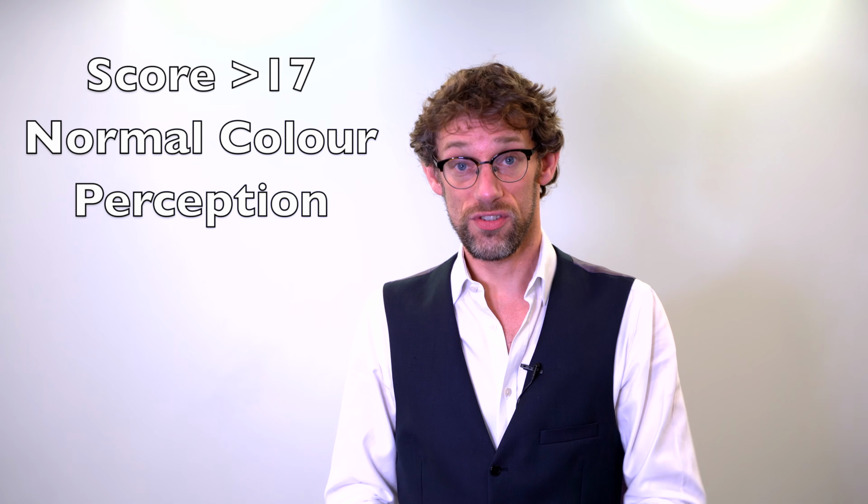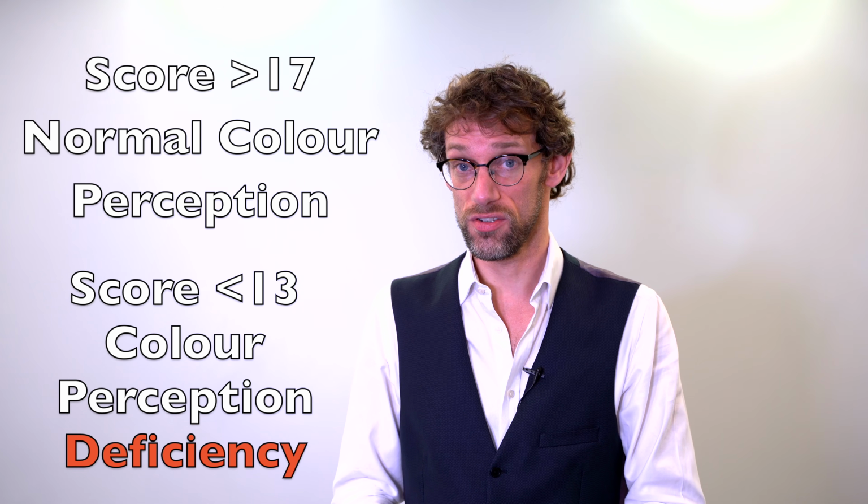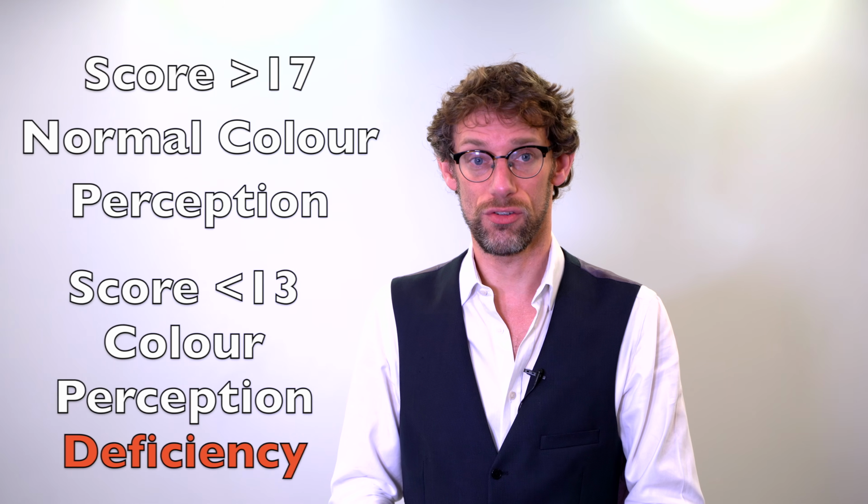Now, medicine isn't black or white, you'll have to pardon the pun here, and thus we're going to score a patient on these charts. It's not pass or fail. What we will find is someone who scores over 17 is considered to have normal colour vision, while someone who scores under 13 has a colour deficiency that we'll be able to clarify later on.